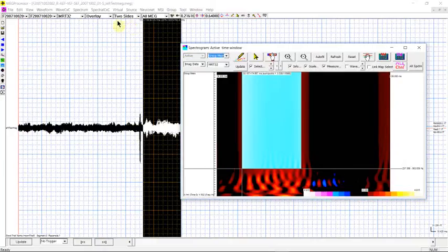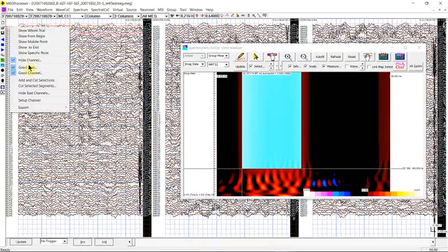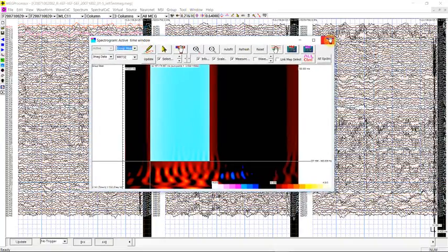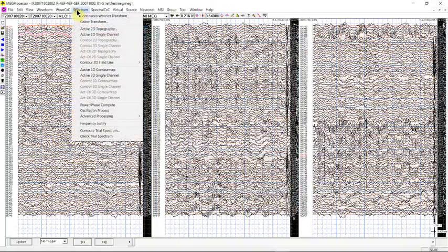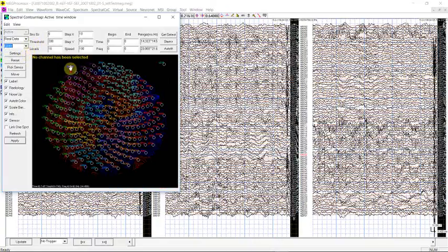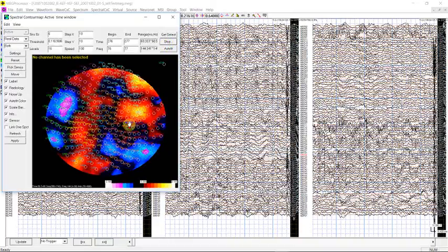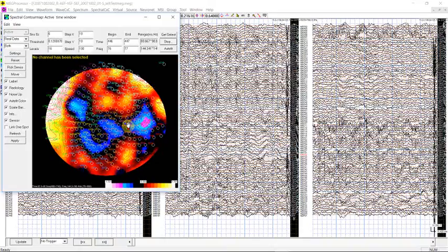Regarding the visibility of the channels, typically we adjust from here. Select the channel, click the right mouse, visibility, go to channel, right channel. You can hide the channel. So this is the spectral power. You can also look at the 3D field. So this is just another way to look at the data. And this is both contour map. You can see, once you start, contour maps of the data.